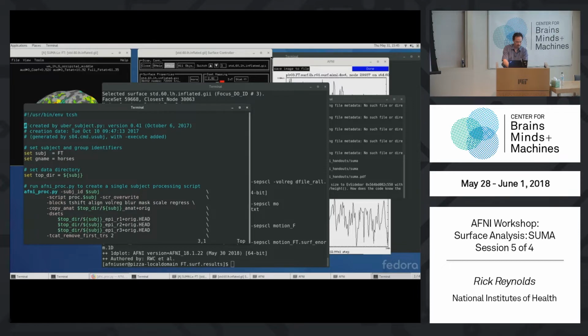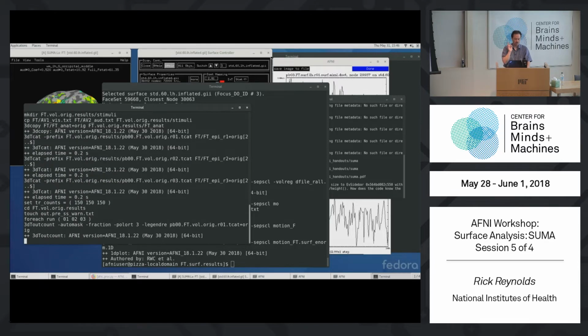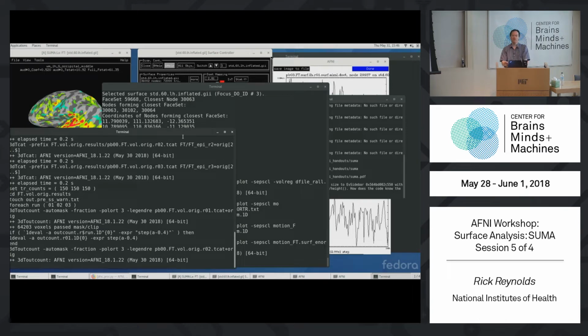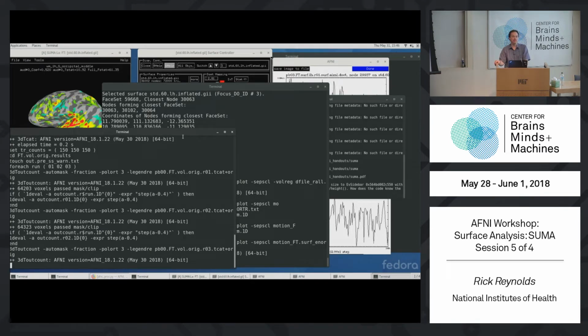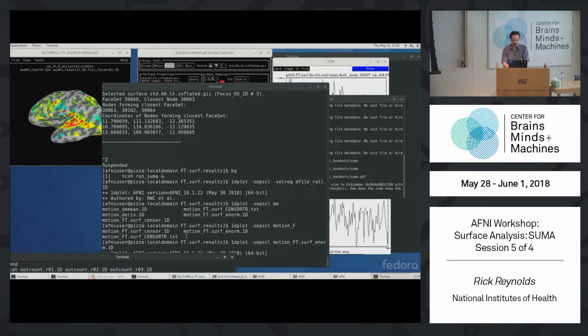Fine. I'm going to change my subject ID. We'll call this subject.ft.vol.orig. We'll call it orig space. Okay. So I'm going to tcsh it. You are off and running. So that's going to do the same analysis as Tuesday, but not go to standard space. Otherwise, the same. And let me just dump you down here.